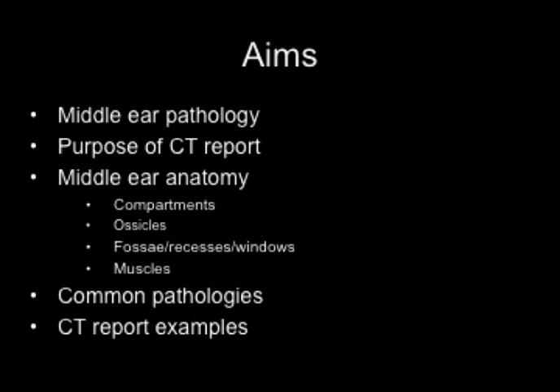About 9 minutes of the talk is on anatomy, so the whole anatomy of the middle ear. There are various parts of the middle ear which I'll go through. Some of them will be familiar, some will be less familiar. The common pathologies, I'm going to show just 4 common pathologies, because again, you're not likely to see a whole spectrum unless you're doing it full time or seeing a lot of cases. And finally, I'm just going to go through 3 cases of how I would report the CT.